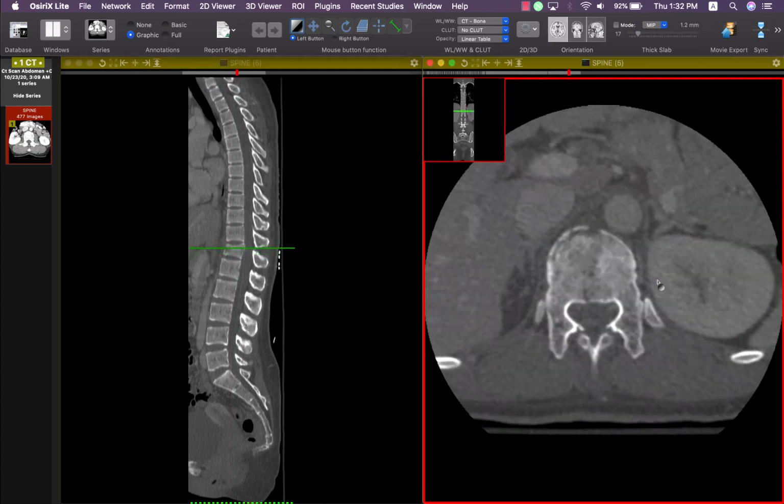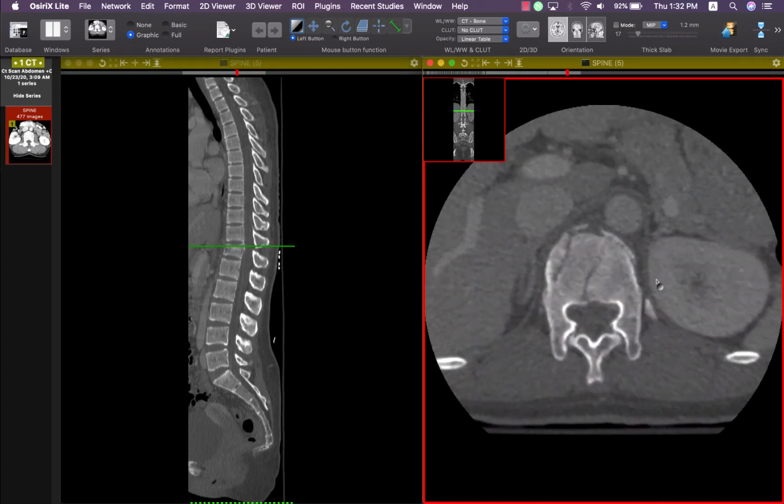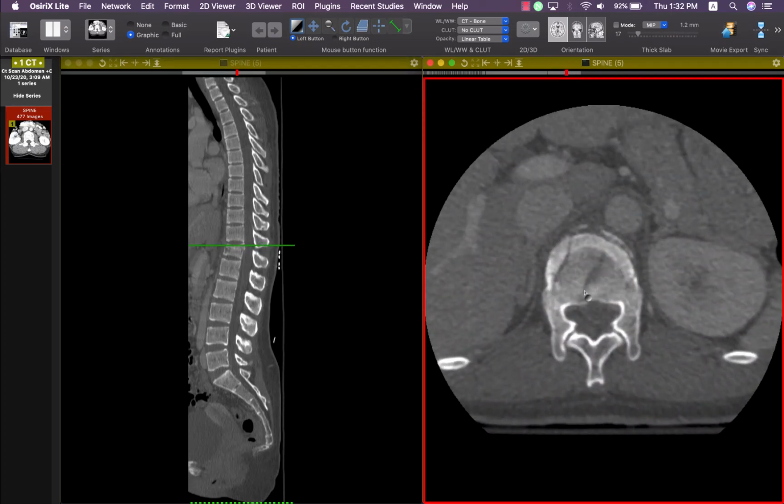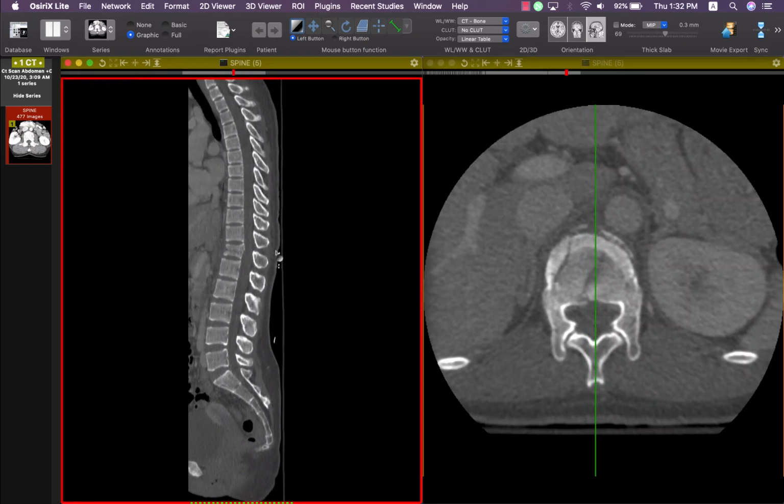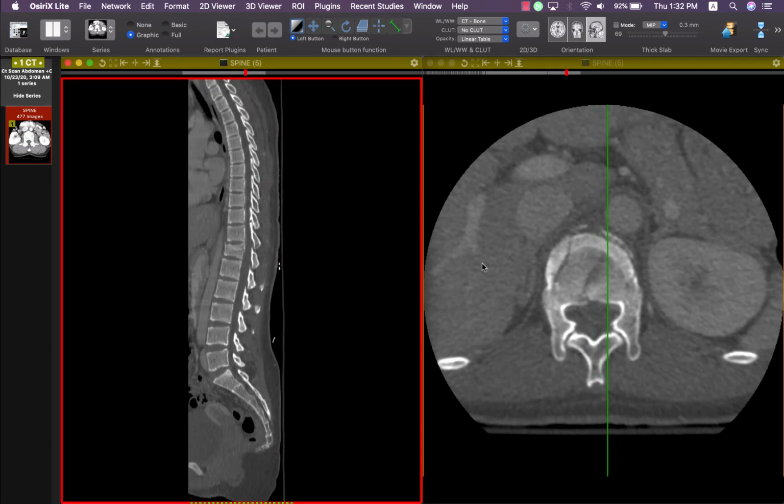In the axial images, we can see the comminution in this vertebra. If we see here, this is a fracture, and this is a fracture. So there is a comminution of the fracture, and this is typical for burst fracture. This is not a compression fracture. So this patient has a D12 burst fracture, not a compression fracture, with affection of the posterior cortex, minimal retropulsion, and comminution of the vertebral body. And this is the scheme of how to reach the correct diagnosis for spinal fracture.